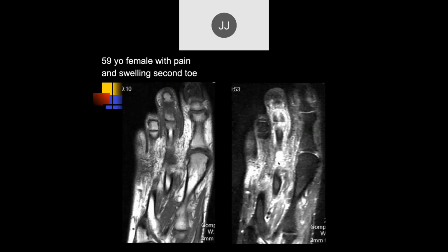What's interesting is the big difference in the metatarsophalangeal joint of the first toe. You don't have a hallux valgus, and she's 59 years old, so she's been wearing shoes like that would be normal, which is unusual, isn't it? Yeah. In what we see in our lectures. Okay.